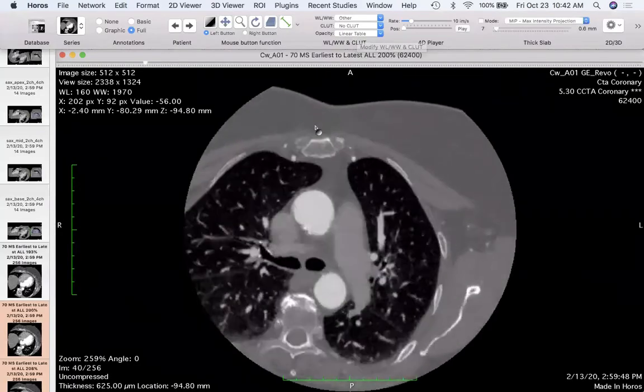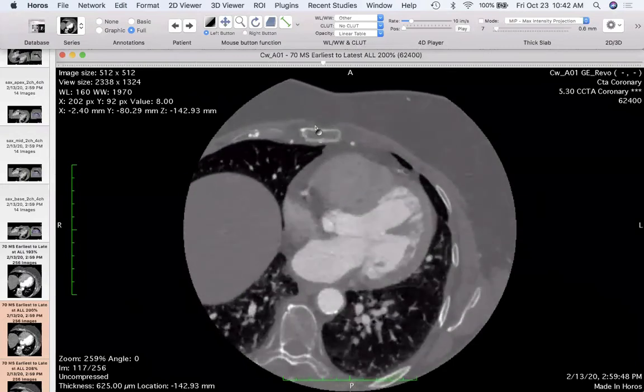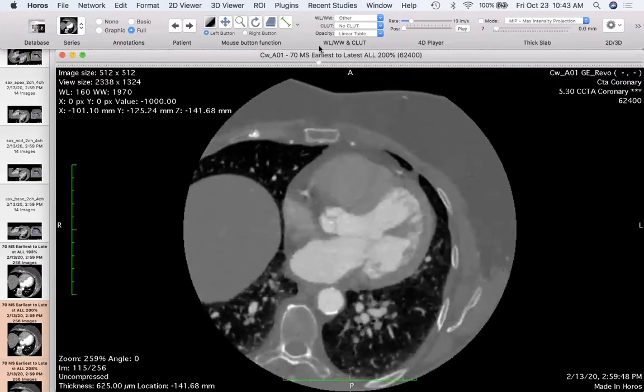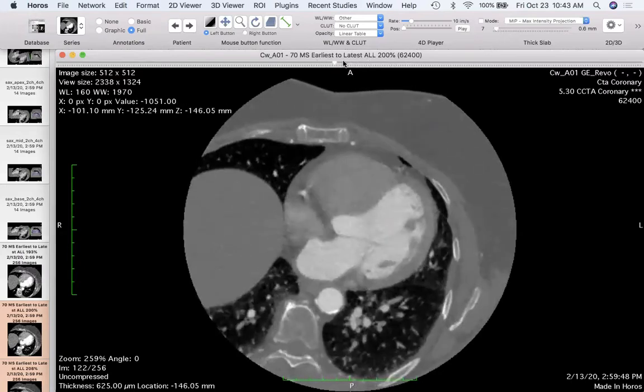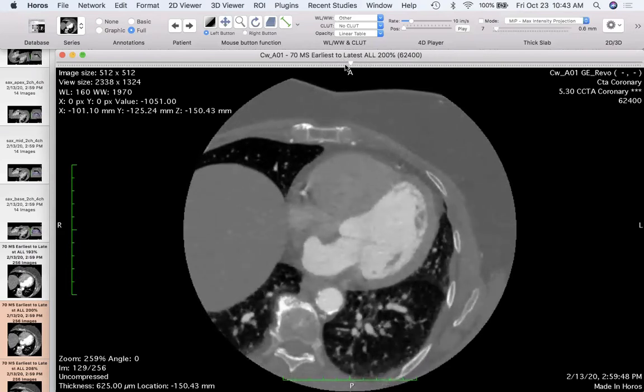now I can look at my first set of slices, and what I'm doing is I'm taking 2 fingers and I'm going up and down on my mouse pad, or you can take the arrow and you can run up and down here, right, to go through the slices. You can also use the left, right arrow keys to go one slice at a time, okay, in space. So, you know, you can quickly just look at the picture, right, and see what we've got.